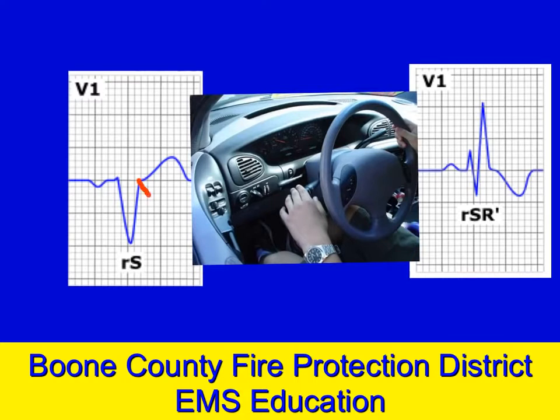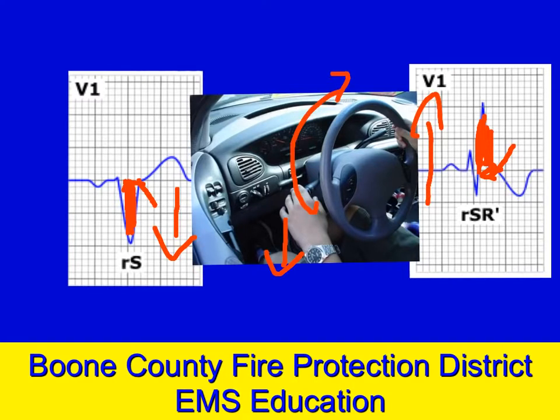You find the J point, which is the end of your QRS complex and the beginning of the ST segment, and from the J point you draw back into the complex and color it in. So what we have here is a primarily down pointing complex, which gives you the left turn. That's a left bundle branch. Over here on the right, you find that J point, you color back into your complex. We're pointing up, so that would be signaling for a right turn.